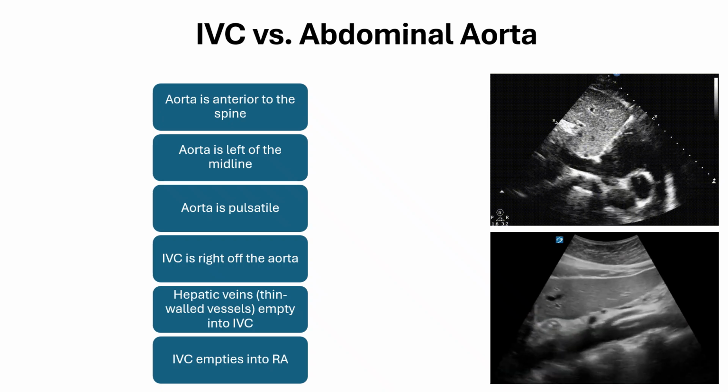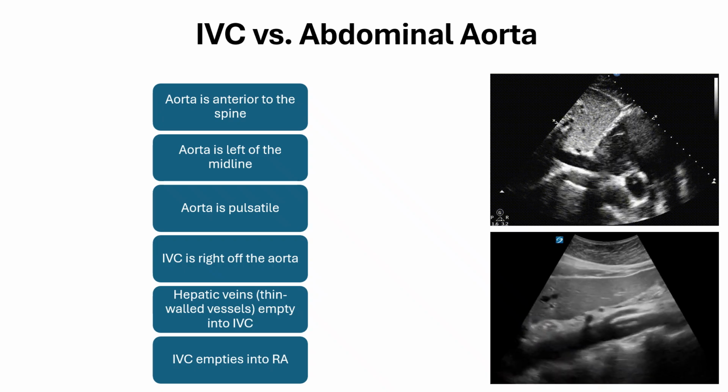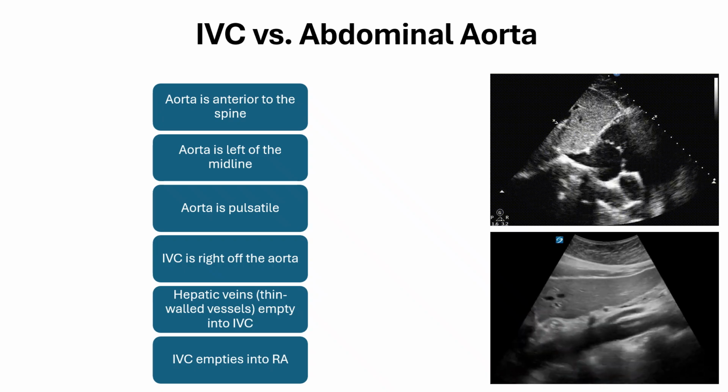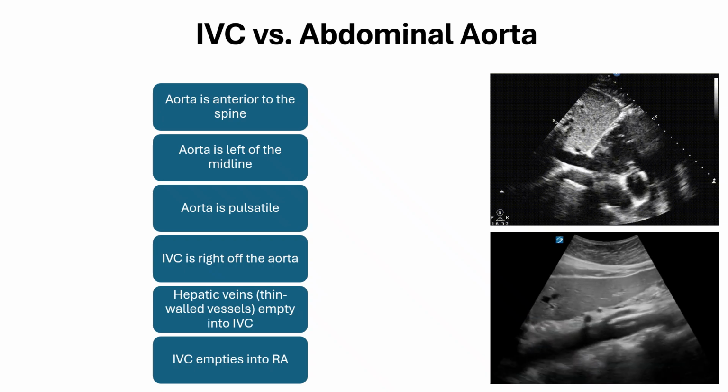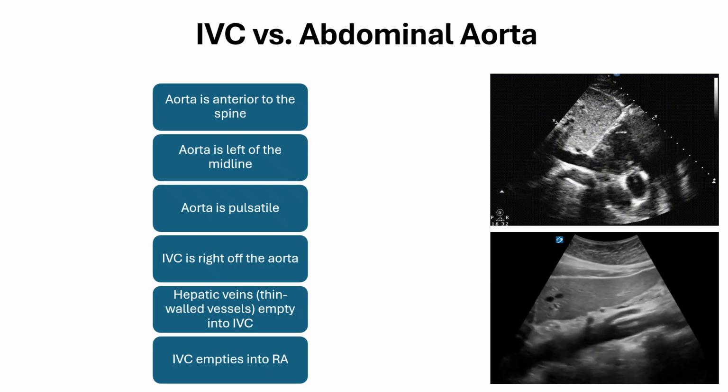Again, it is not surprising that sometimes it can be confusing, but in the vast majority of cases, you'll be able to easily differentiate between the two vessels. Please pause the video if needed to review this slide in more detail.